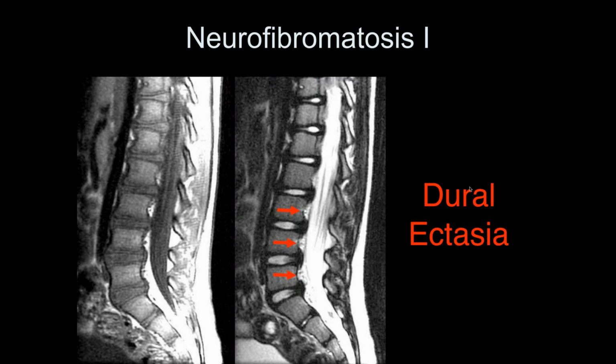Can you describe the finding, please? It's the prominent indentation here, posterior to the vertebra, and this is not something that I call on an interpretation, because it also looks like you may have some thickening of the annulus here at each of these levels.